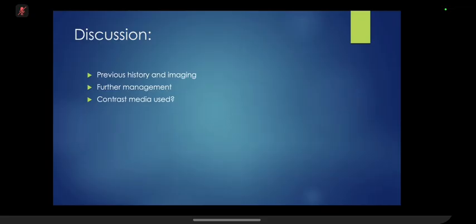Okay, good. This question was asked in the exam setting multiple times: what kind of contrast media you will use when the patient is post-operative. So the easiest way, not to go into the details of what kind of contrast media it is, iodinated or not iodinated, they just want to hear that you say a water-soluble contrast media. That's more than enough to conclude the case, because you are trying to avoid complications in the baby, which is already having a lot of post-surgical changes in the chest.